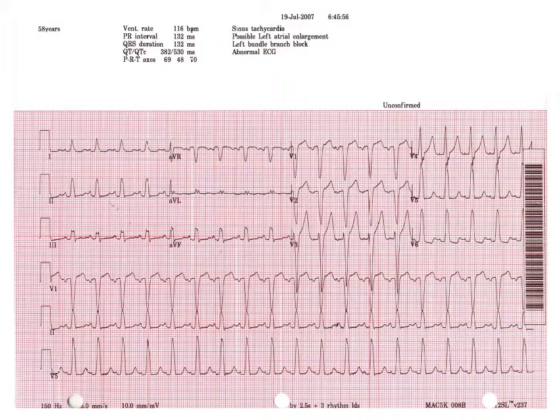All right, what about this EKG? Let's look at a rhythm strip at the bottom. Here you actually have three rhythm strips. You have V1, 2, and V5 to choose from. I like lead 2 as my choice of rhythm strip because that's kind of the most normal, so to speak, strip to look at. So if you look at that, is this regular?